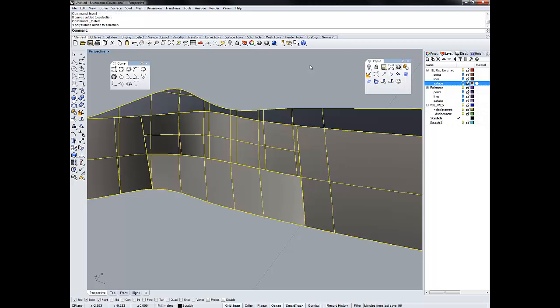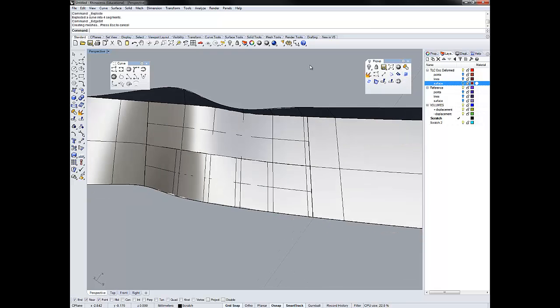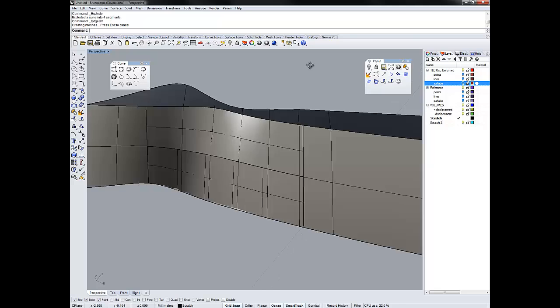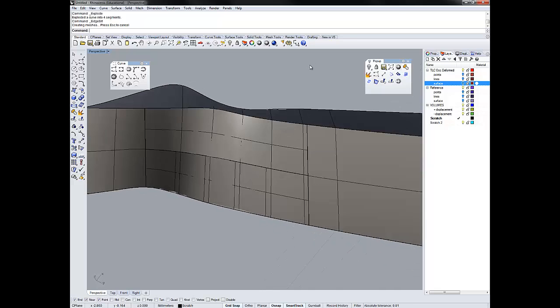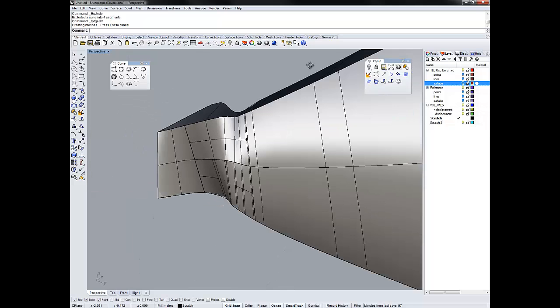So now we have this to contend with. So do border, we now have this 4, and let's see if we can explode it and try our surface and see if that fixes it. And what I notice is that the geometric inconsistency is a little different now. Not necessarily better, but that's what we get from doing this reference geometry here.